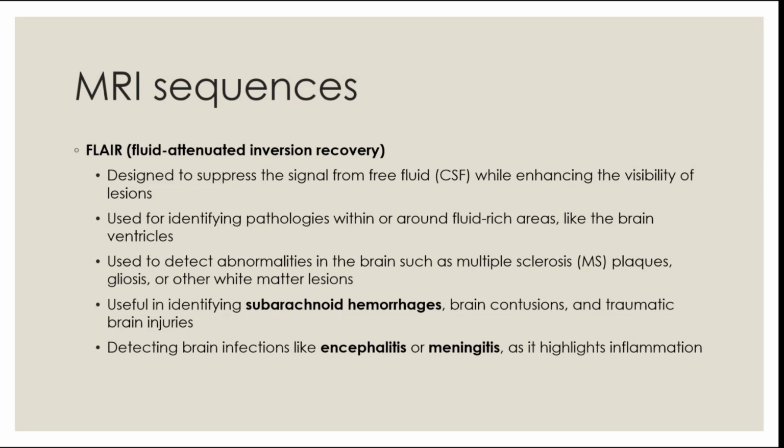For example, in the brain, in the ventricles, you don't want to see the CSF, but you can see other structures that are in the CSF, for example a cyst or calcifications. So you can use this in multiple sclerosis, in brain inflammations or infections like encephalitis or meningitis.